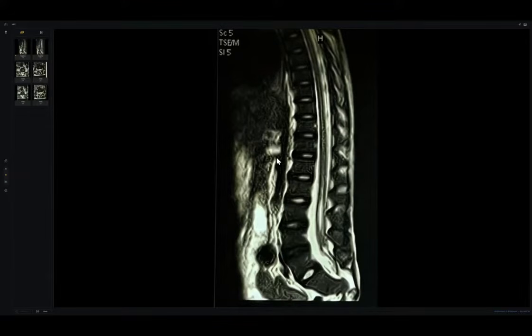There was one case like this. The examiner brought it, and it was not static. It was DICOM, multiple series. And when you scroll, you will see bilateral hydronephrosis by the aorta. So you should tell the examiner, doctor, this patient has bilateral hydronephrosis. He may have a neurogenic bladder. I want to do an abdominal ultrasound.